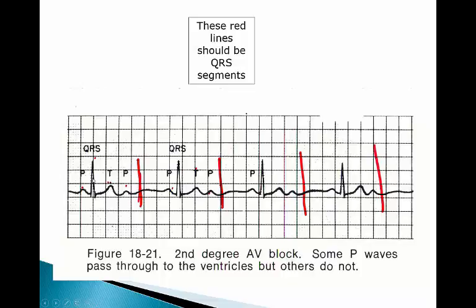However, the patient's heart rate is only 4, or 40, because every other beat is not conducting, and you're not having any ventricular response because it's being blocked. If you don't have any ventricular response, you do not have cardiac output. So in this case, because the heart rate is really only 40, you're probably going to be hypotensive and have perfusion issues, like syncope and dizziness.